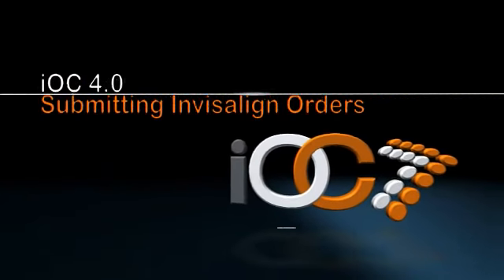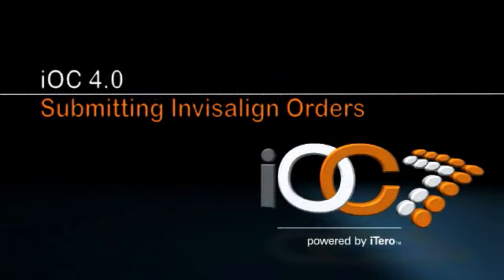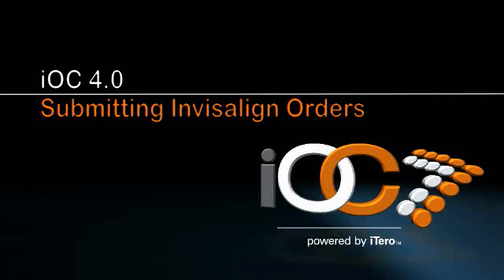After you submit your completed Invisalign scan, wait about 15 minutes before submitting your Invisalign order. To do so, log into your Invisalign doctor site and then select the patient for whom you are submitting the order. If this is a new patient, be sure to add the patient first before starting the prescription.